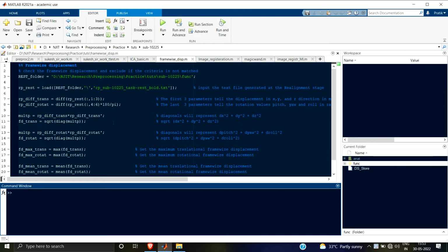So in this video we'll focus on how we can co-register an anatomical image and a functional image and align them together. Okay, that is the task for this video.